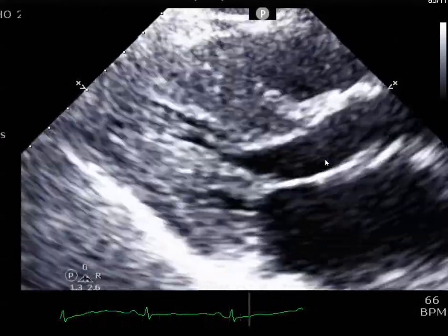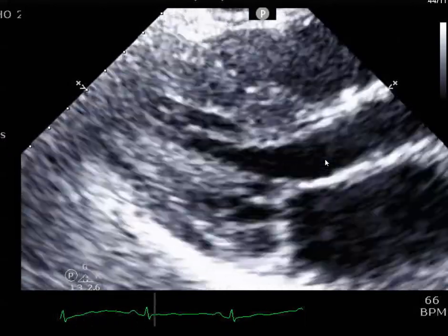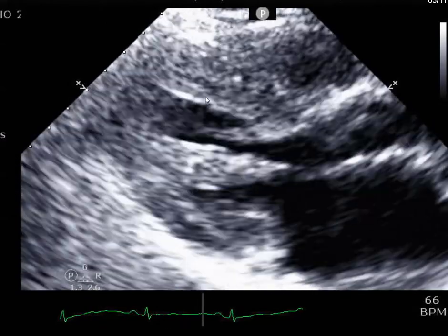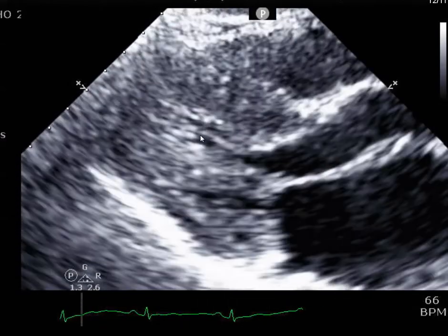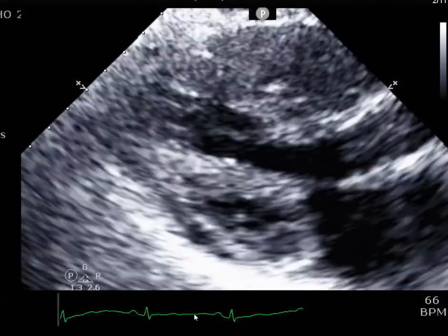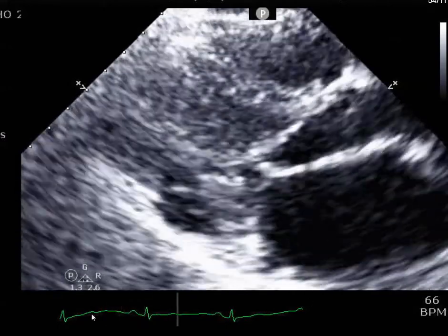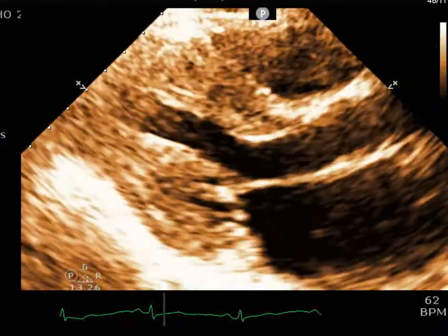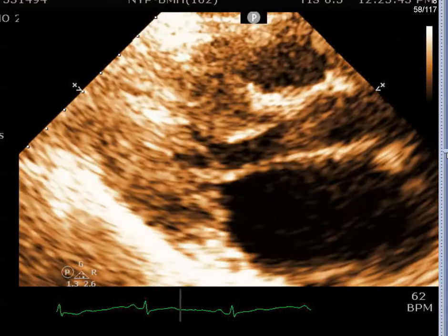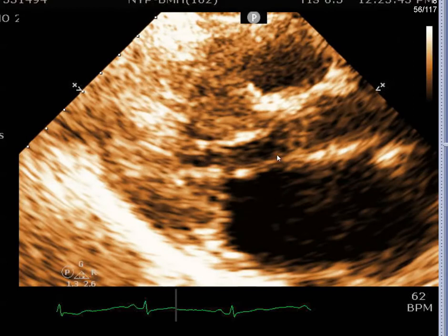One of the things that's markedly noticeable on this initial parasternal long axis view is that the walls are very thick, and when the walls are contracting, you basically are obliterating the LV cavity. If we were to take this moment in systole, here we go, and it's systole here. You can see what a small tunnel the blood has to go through to reach the rest of the body. So that's not a lot of space at all.